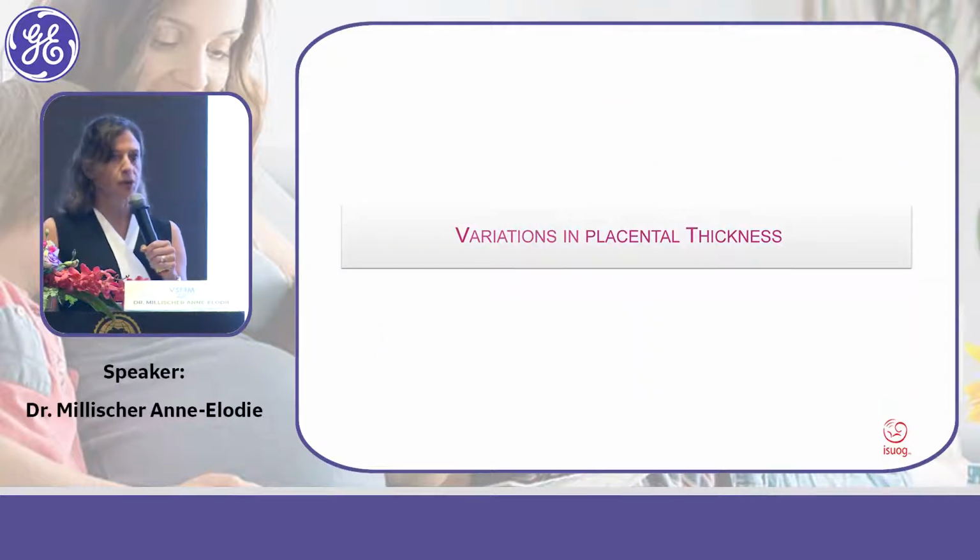The second point that we have to notice on our report is the thickness of the placenta.